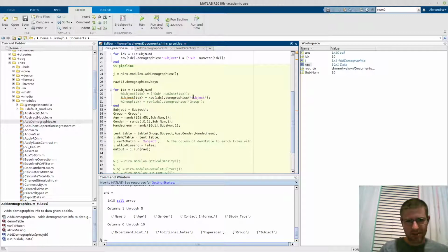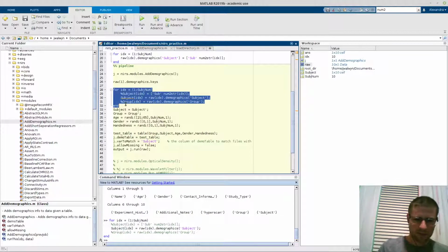If you want to pause it, you can look at these. These are other things you could add in if you want to add in different types of stuff. This is an alternative to how to do the subject index, which is kind of what we did here actually. I'm going to do it this way. I think it's cleaner that way. Then I have to concatenate it. So let me go ahead and run this first, and you'll see what we get.